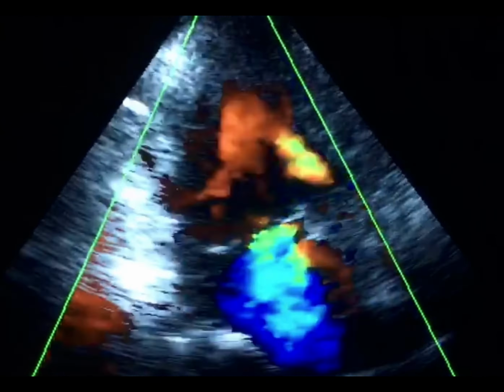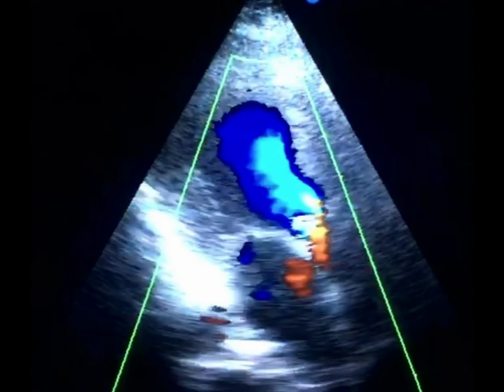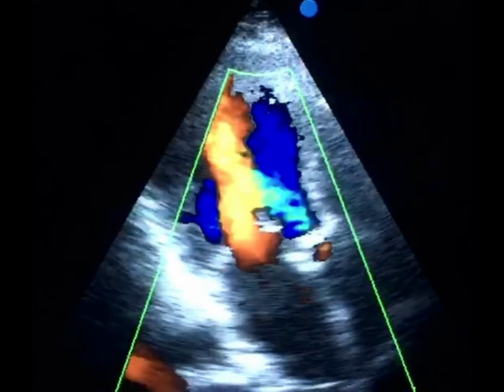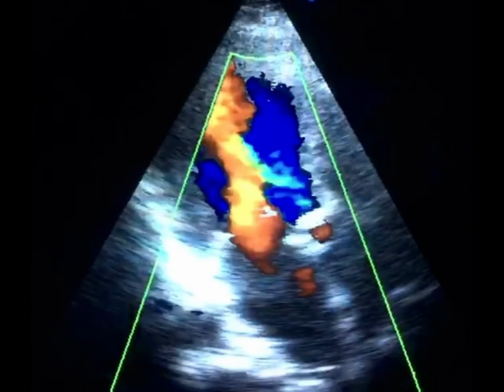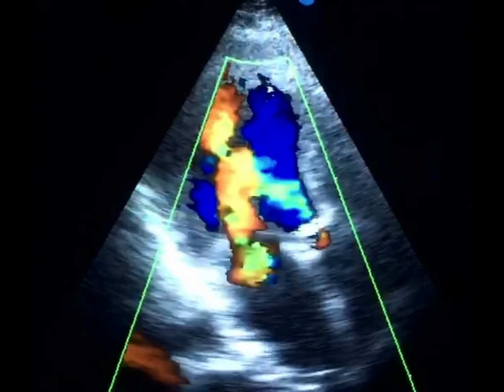It shows a late systolic MR, which actually lasts for less than half of the systolic phase. In fact, it's much less severe than it might first appear. Paying attention to the duration of MR is essential, because a brief, intense jet can seem more severe, while a mild-looking jet that persists throughout systole may have a greater clinical impact.